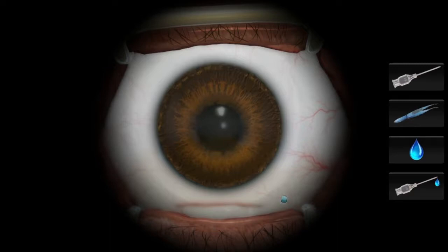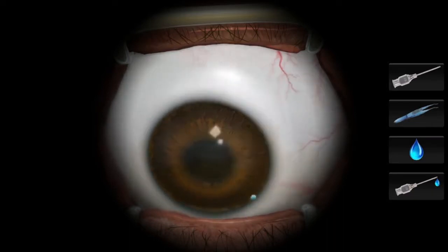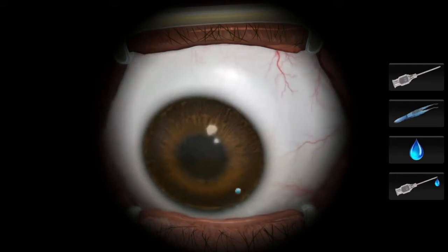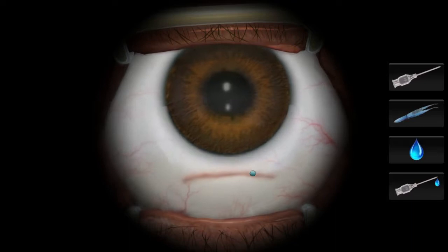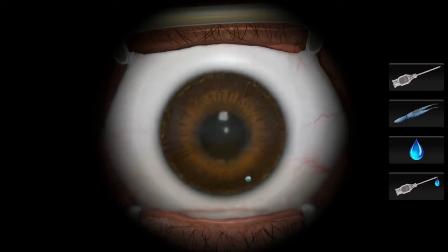The eye in this simulation is built to replicate the human eye anatomically, visually, and physically, so it behaves exactly as it does in the real world. For demonstration purposes, we can use the grab tool to drag the eye around in the socket. This shows the slight inertia and weight of the eye as it moves, and resting in place when it's let go.